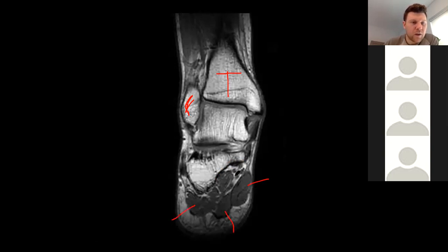Very good. Sorry, someone wants to see the deltoid again. So going from the tibia to the talus and even some parts down to the calcaneus, this is all the deltoid in there. You can see that thin layer we talked about beforehand. See this thin black line? There's your retinaculum, and then your tendons, and then your deltoid, and then your bones. So just always think anatomically what you have to cut through to get down to bone.